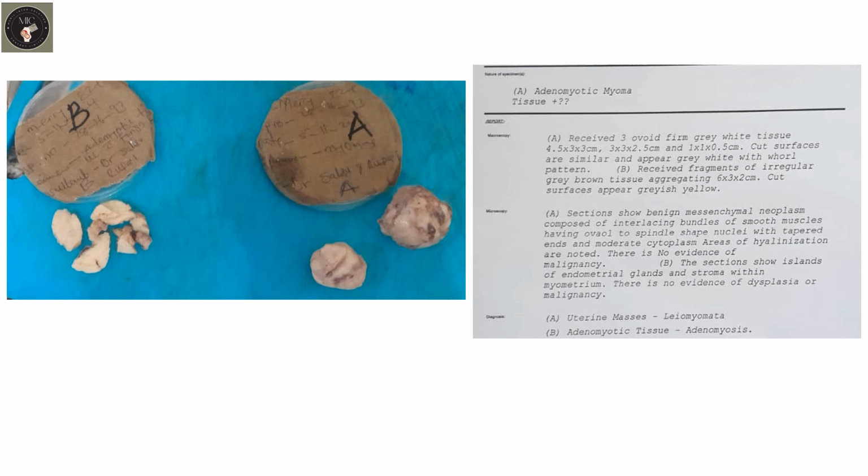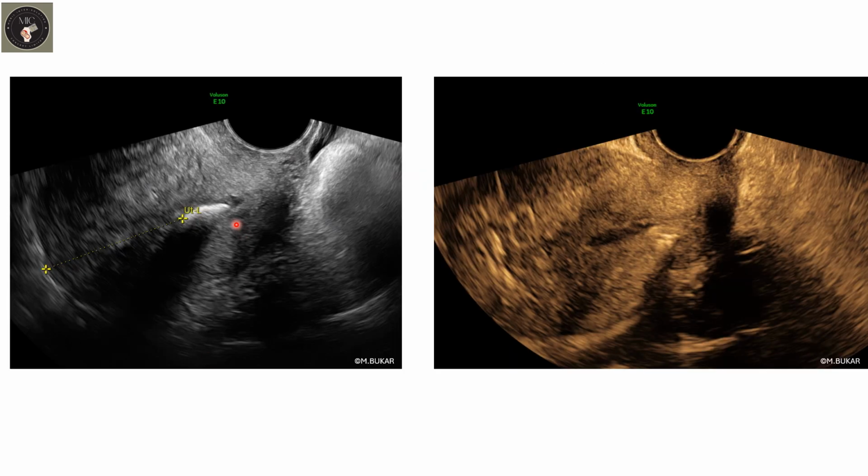So now look at this before surgery, and this was after surgery. So remember, this is the uterovesical fold here. This is the uterovesical fold here. If we trace it here, it will go down around the internal os. So look at this linear echogenic lesion with acoustic shadowing before surgery. It was around here. So why is it?